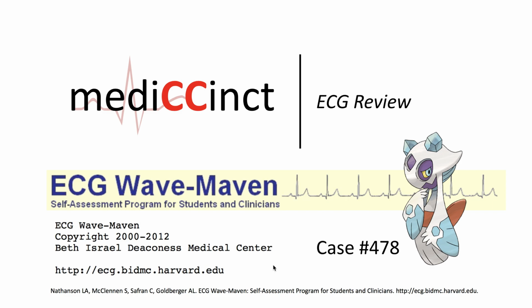This medicine ECG review will focus on case number 478 from ECG Wave-Maven.